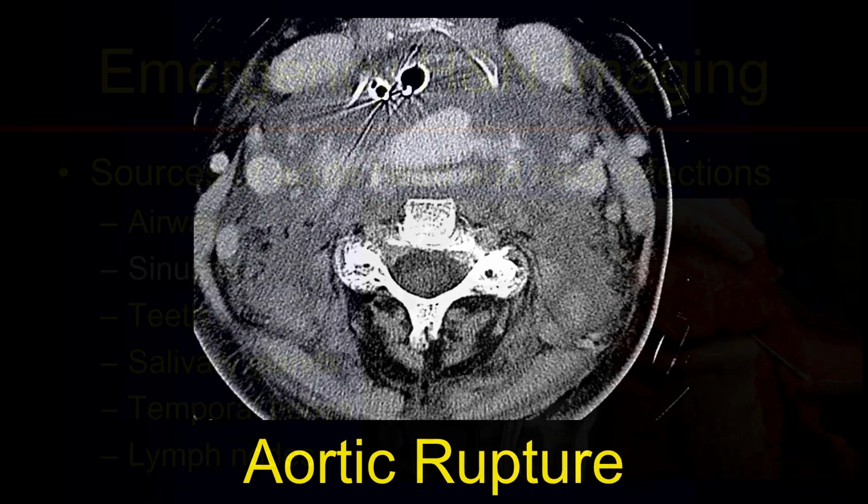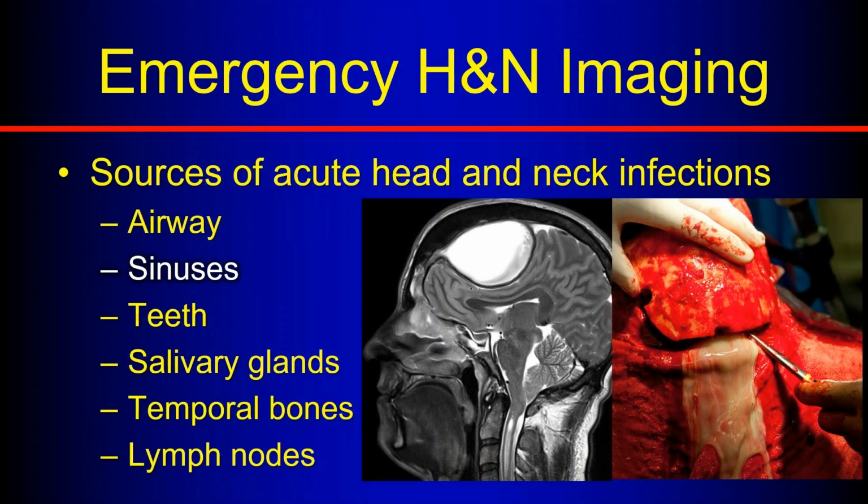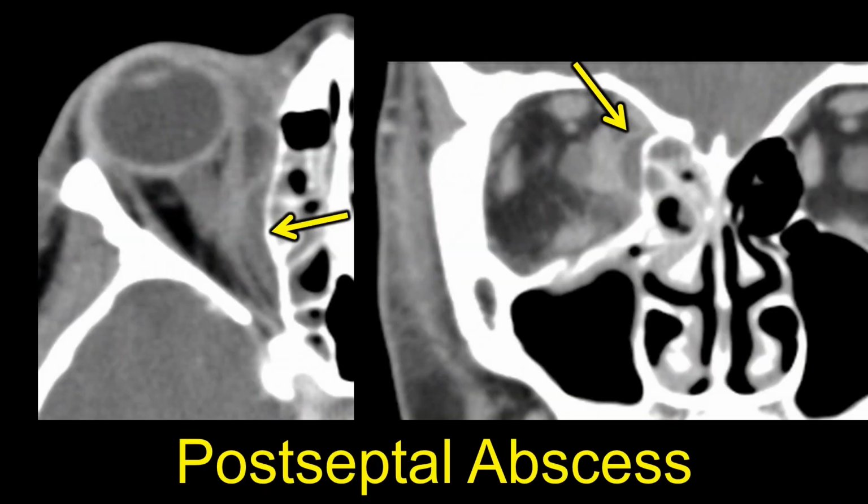So those are some emergencies that we see around the airway. So next we have the sinuses. Now, frequently we don't get that excited about sinus disease itself. People often blow off sinus disease in these cases.